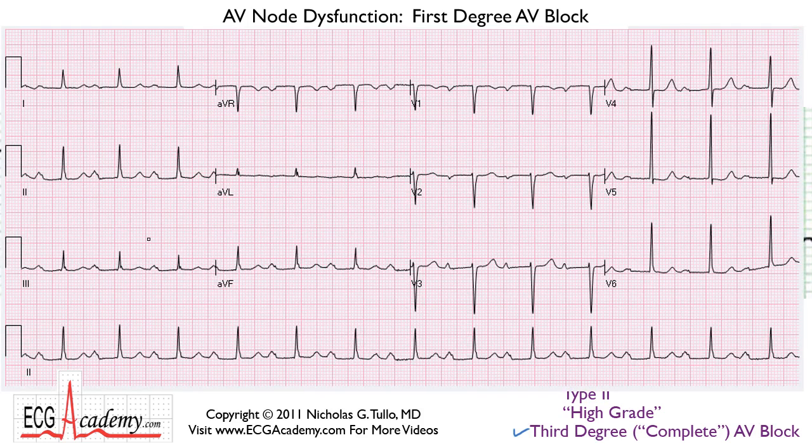Now, here's a 12 lead, but I want you to concentrate on the rhythm strip down here on lead 2. If you kind of scan across, look at the forest first, you can see that the QRS complexes are quite regular, and they're at a rate of, I'd say a little above 75, maybe 76 or 77 beats per minute.